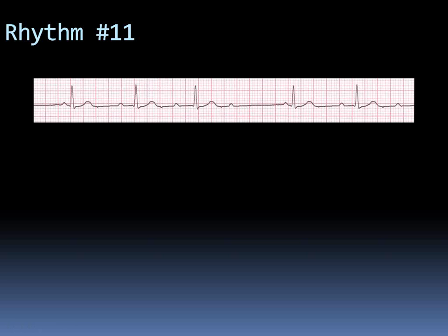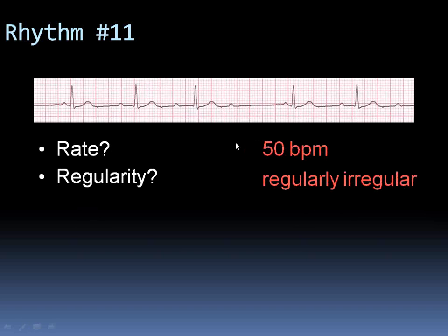This is how a second degree type 1 heart block looks. You would have PR prolongation and you would have dropped QRSs for every third or fourth or fifth or sixth P wave. There is a QRS for every P wave for the first 3 beats, and then there is a dropped QRS. So the PR lengthens until there is no QRS. This is the ECG of a patient with type 1 second degree. Okay? It is irregular because every 4th beat you will have no QRS. So when you palpate the pulse, it will be irregular.